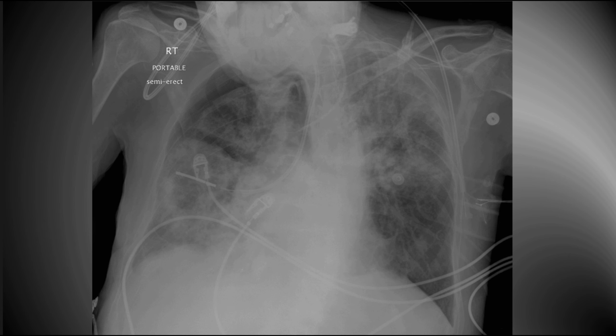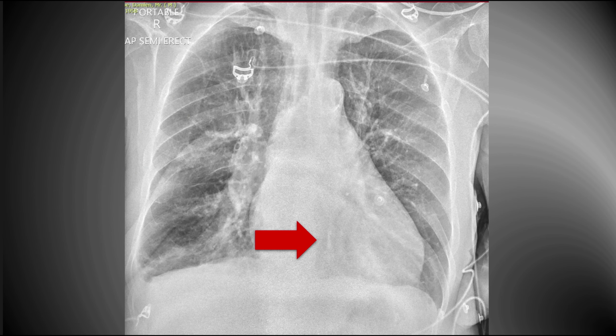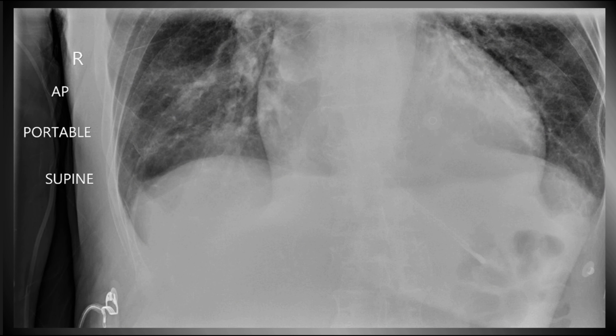In this picture, you can see the tip of the NG tube in the airway of a very diseased right lung, and this has resulted in a pneumothorax. If you look carefully, the tip of the NG tube is in the esophagus. It had previously been correctly placed, but it had slipped backwards. In this picture, the same patient's tube had been advanced into the stomach.